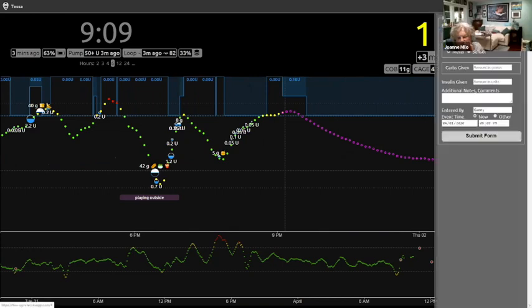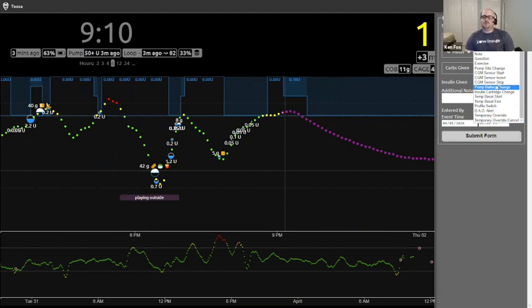Can you add event types, or whatever's not there, you put in? Oh, good question. Okay, so most of these are here by default. A few of them show up when you turn on certain features. So if you have Open APS as one of your enable options, it'll show a target change option. If you have override enabled, which is needed not just for showing the override pill, but also for enabling remote override, you'll see this temporary override and temporary override cancel activity. So a few of these activities are triggered by the enable, but the rest are just built in and you can't really add your own.